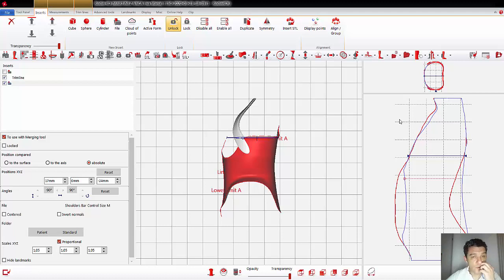Sorry, I forgot to show you one really nice tool, the pilot tool. For example, you can use it for many rectifications, but in this case it's interesting. The process, you can see, is very fast. I spent a lot of time because I was explaining everything, but it's really fast and simple.